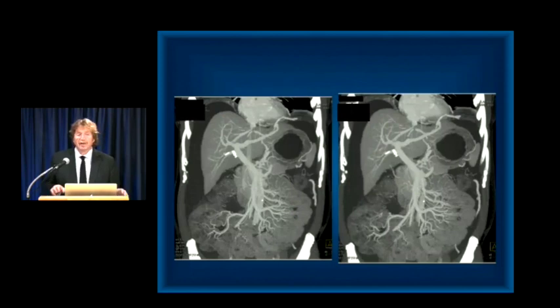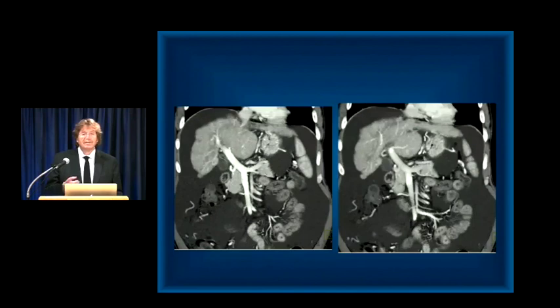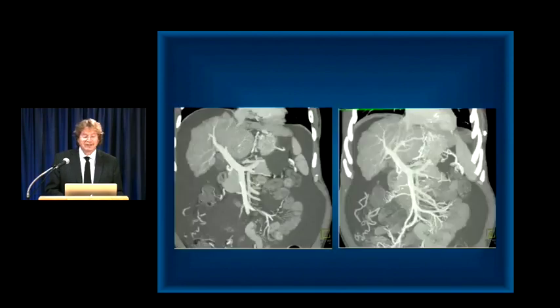in MIP imaging, but you see the very large branches coming off the SMV and IMV. You really can appreciate the portal hypertension and the collateral flow pathways that are very nicely seen. In this case, however, when you look at all of the images, you don't see hepatoma, you see the irregularity. You feel very comfortable talking about this being a cirrhotic liver, nodularity, portal hypertension, ascites, but no evidence of hepatocellular carcinoma. And here's just a few more images showing you MIP and volume rendering.